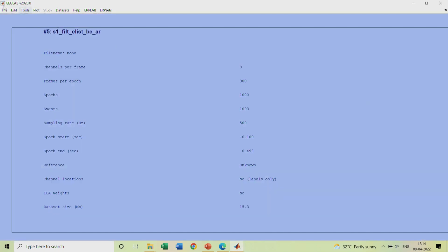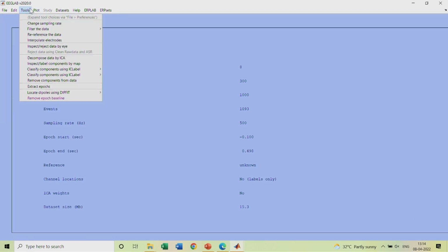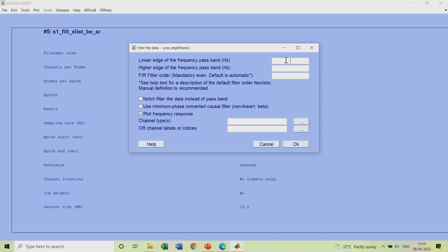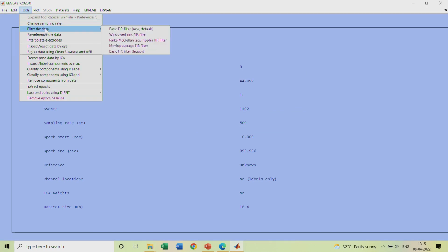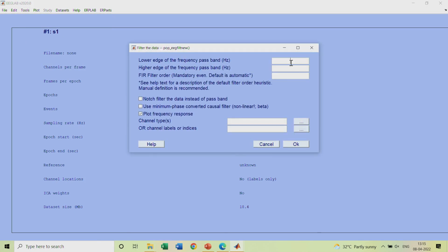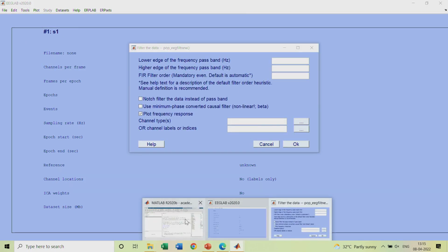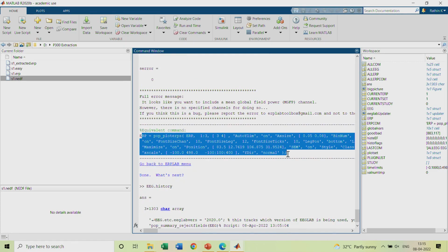Okay, fine. What I will do is I will again import the data, or let us say I will do the basic filtering to your initial data, because this we have already done. It is just to show you a glimpse of how you can convert GUI to scripting. If you scroll here, you can see the equivalent command everywhere. When you are plotting, this is the equivalent command.